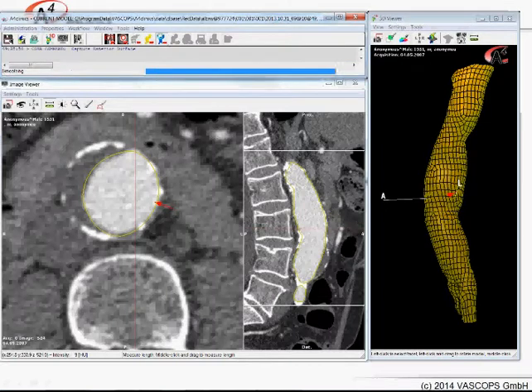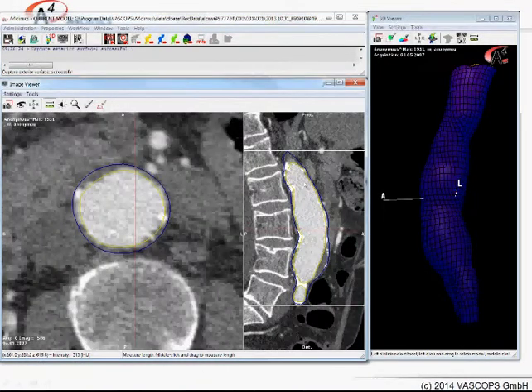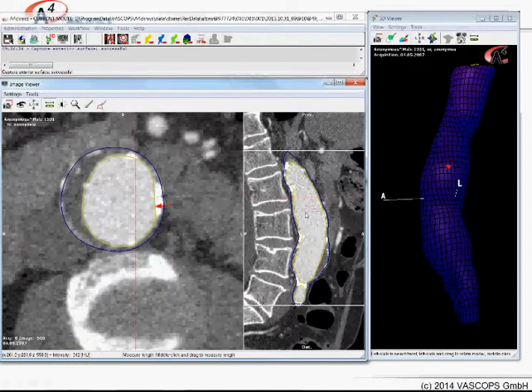Again, we click on this button to segment the exterior surface. The blue line here is now the outer surface segmentation model, and now you see it approaches here. To be honest, there were control polygons on several slices in order to get this very nice result at the beginning. So if we are there, we can stop it, and then you're supposed to run through your segmentation and see where it's supposed to be more accurate.